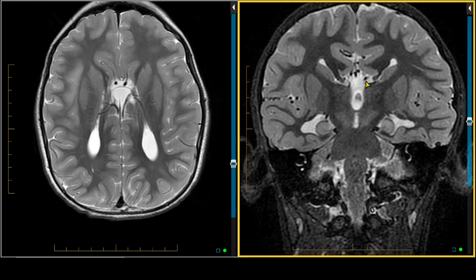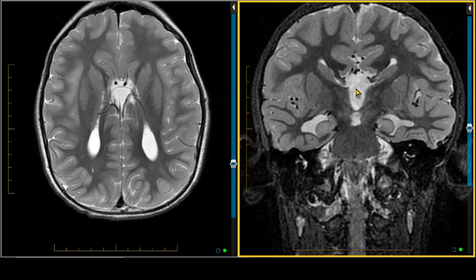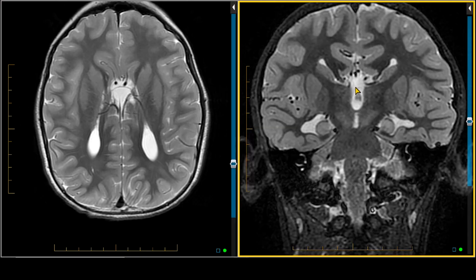One of the other things we see, in addition to this vertically oriented third ventricle, is a characteristic configuration of the interface between the third ventricle and the lateral ventricles, which has sometimes been referred to as a Texas Longhorn sign, or in some cases like this, may look sort of like Bullwinkle the moose. Along the medial margin of the body of those lateral ventricles, there's a bundle of white matter here. These are the fibers that would have crossed the corpus callosum, but they don't. So they are directed anterior-posteriorly instead of directed laterally to go across the corpus callosum. This area is known as Probst bundles.